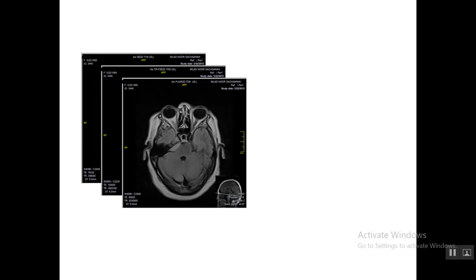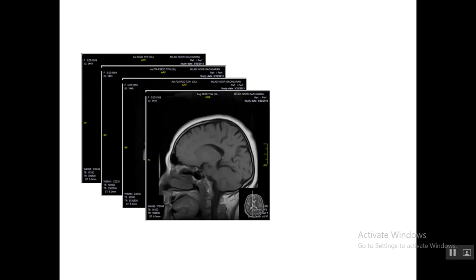I think some of you took a guess, and maybe you noticed the asymmetry of the picture, signal abnormality of the right temporal lobe appearing different from the other side, and maybe we can find additional abnormality on axial images.